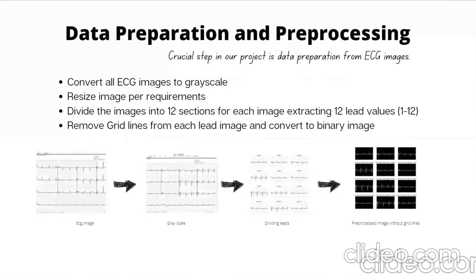So now coming back to the data preparation and the pre-processing stage. Once we got to know about the data sets that we are dealing with, there were 4 categories of data. One corresponds to normal ECG images of healthy persons, another to people who had myocardial infarction, others to people who already have a history of myocardial infarction, and finally, people who have abnormal heartbeat. In each of these categories, we had around 250 images. So there were literally 1,000 images in our complete data set.